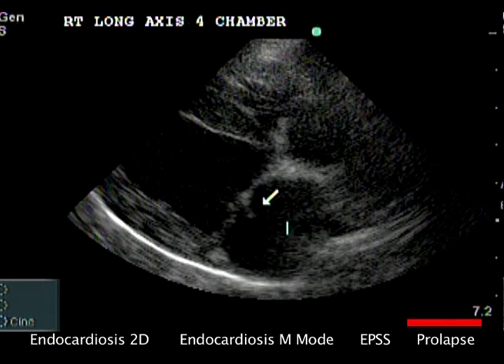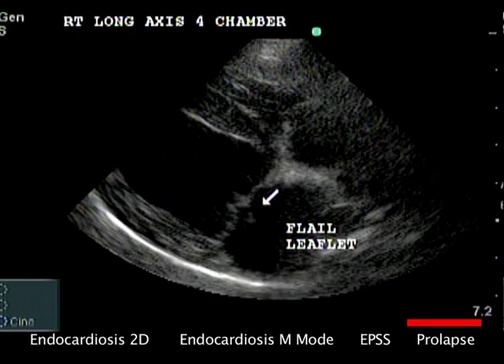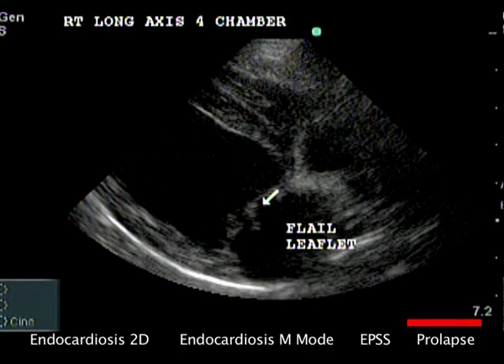It indicates severe mitral insufficiency regardless of left atrial size. In cases of acute rupture of chordae tendineae, the left atrium has not had time to dilate, and sudden death can occur. Patient survival may be very short, and prognosis is poor with flail mitral leaflet.